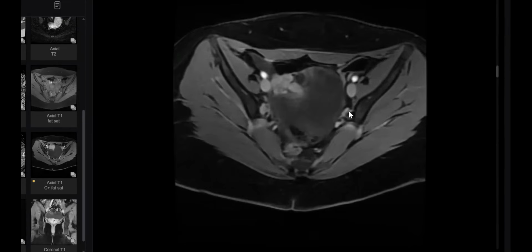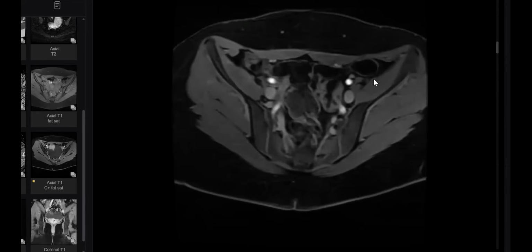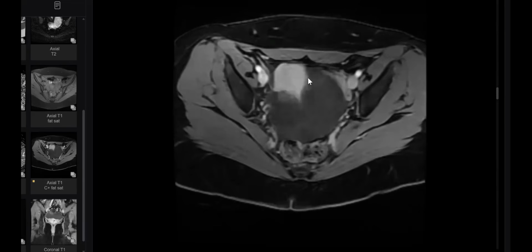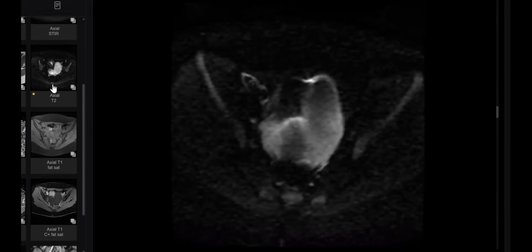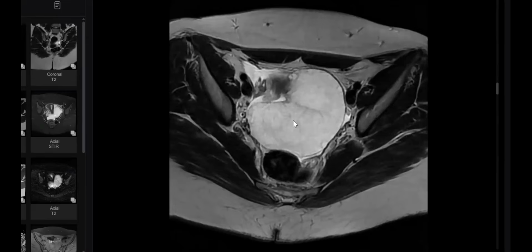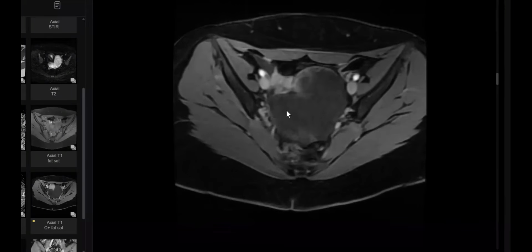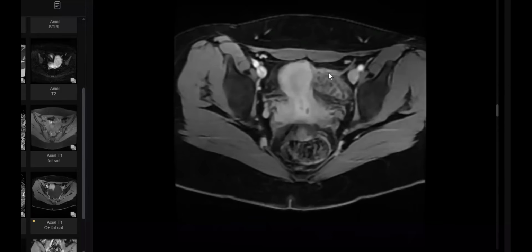Lack of complete enhancement. So this is likely late, very late. No, no, alhamdulillah. Although no contrast enhancement is seen, or scanty at the periphery, you see, scanty, but still the edema is good. T2 showed massive, significant edema. No heterogeneity, no low signal intensity, no hemorrhagic infarctions yet. This ovary can be saved. Till now, it can be saved. No heterogeneity. And this is the normal enhancing left ovary.